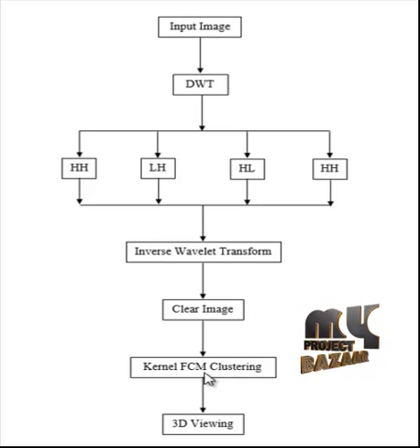After the extraction, 3D viewing of the input images is done. The segmented portions alone are shown in 3D viewing in order to view the images in 3D locations.